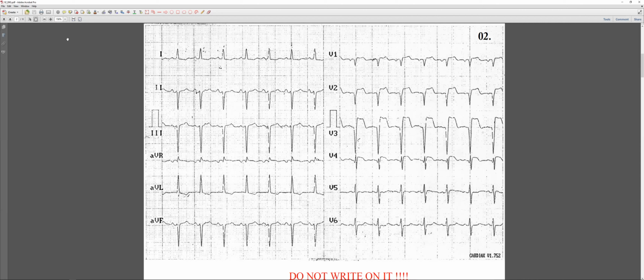No, don't look at the T wave. You have to look at Q and ST, and you do see both, so acute. Nothing to do with the T wave. By the end of the acute phase the ST returns to normal, but as long as you see the ST elevation, it cannot be subacute. Okay, now go on.